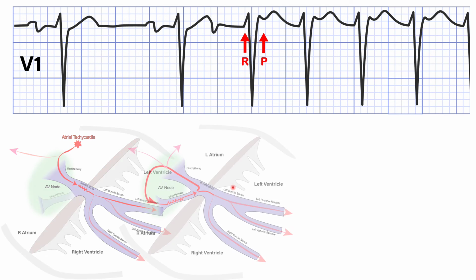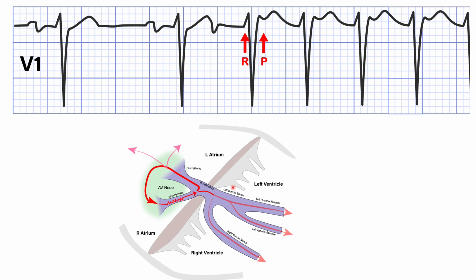Next, we can look at AVNRT. In fact, what you'll find is that this is actually a classic case of AVNRT, where the slow pathway engages both the fibers that lead to the ventricles to cause a QRS and the fibers that lead to the atria that cause the P wave. Those fibers are engaged simultaneously. And so the AV time, or the Rp time, in the case of AVNRT is a pseudo-interval. They take place simultaneously, which is why the QRS and the P wave are often overlapped. So in this particular case, AVNRT is the most likely diagnosis.